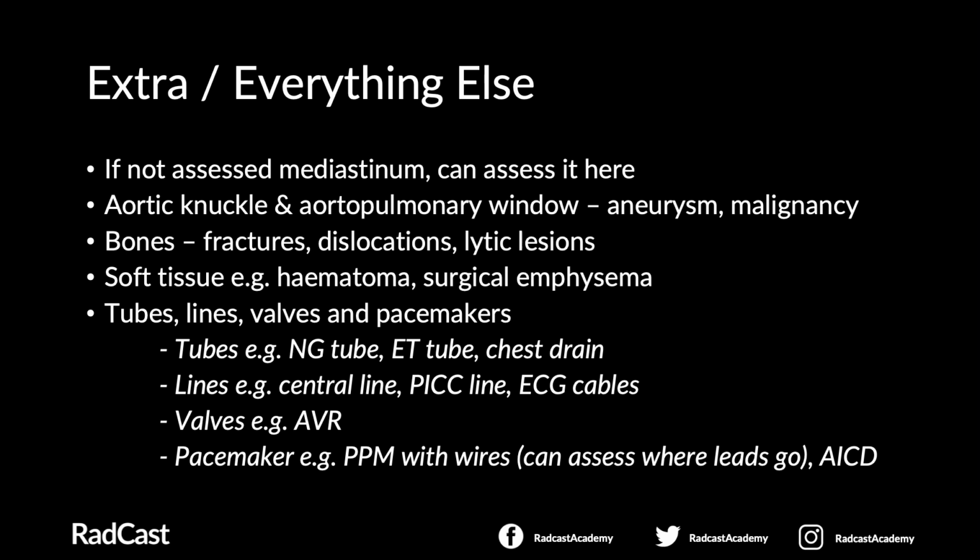Look at the soft tissues. Are there any hematomas present? Is there evidence of any surgical emphysema? And finally, assess for any tubes, lines, valves, and pacemakers that may be present.